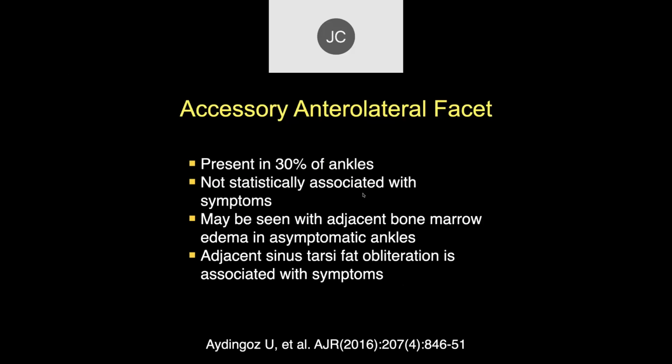If you just see something that looks like a prominent projection of the inferior aspect of the talus in that location without the degenerative changes of the bone marrow edema, it's probably not going to be significant. But if you see it in association with the changes we just saw, it's an uncommon cause of ankle pain in adolescents.